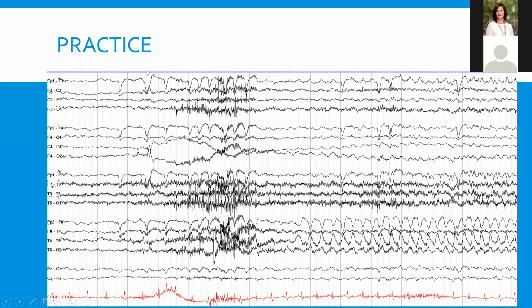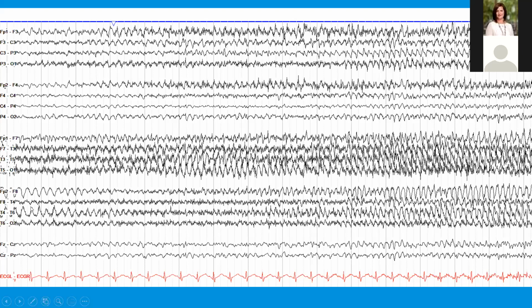Okay, so this is the first page. So this continues. The seizure starts here, and now you can see it's spreading to the entire brain, right? The seizure is starting, and then it's getting faster and faster, and the amplitude is getting higher and higher, and now it's spreading to the entire brain. Okay, let's see if there are any comments. I think I'm almost done actually, so great.